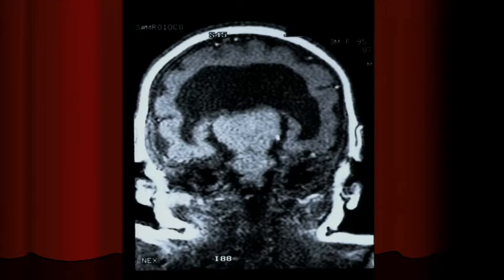So here there's actually a falx. It's trying to make one, but none of the holoprosencephalies have what? None of them have a septum pellucidum, just like all Le Fort fractures have fractured pterygoid plates. Absolutely. If there's a septum pellucidum, it's not due to holoprosencephaly. This is the alobar type. There's no midline differentiation; you've got the huge monoventricle. These are the ones that have midline defects.